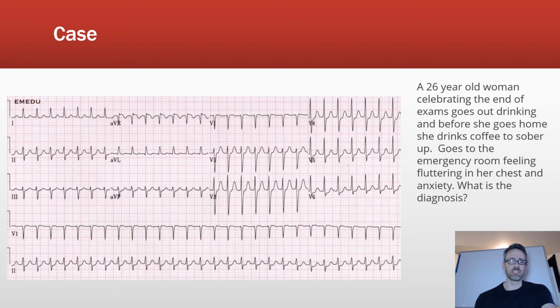So when we see something like this, it's probably happening in a fairly healthy heart for the most part, right? And you'll notice that the QRSs all look very, very narrow, and it's a very, very regular rhythm. If you were to take a look at each R-to-R interval here, all these waves are occurring in a very regular pattern. The patient's also young and responding to you.